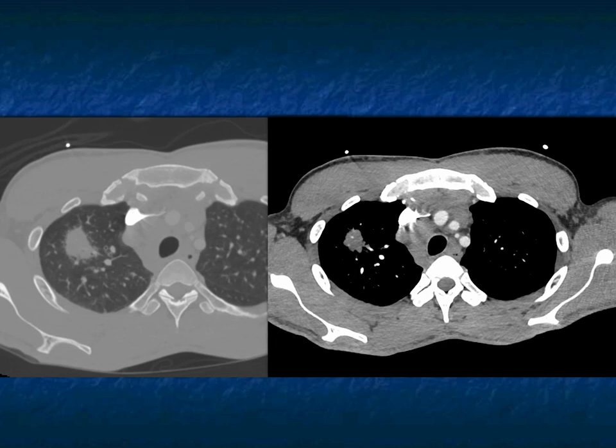Of course, I'd like to see the rest of the image. Is this the only lung mass? How extensive is the adenopathy? What's its distribution? Those will all be critical findings. I show this case in part because you also need to say, well, could this be inflammatory? Could this be TB? Every once in a while we see sarcoidosis, particularly with an interstitial spread pattern. But when I'm looking at this, my first thought is this is lung cancer till proven otherwise.